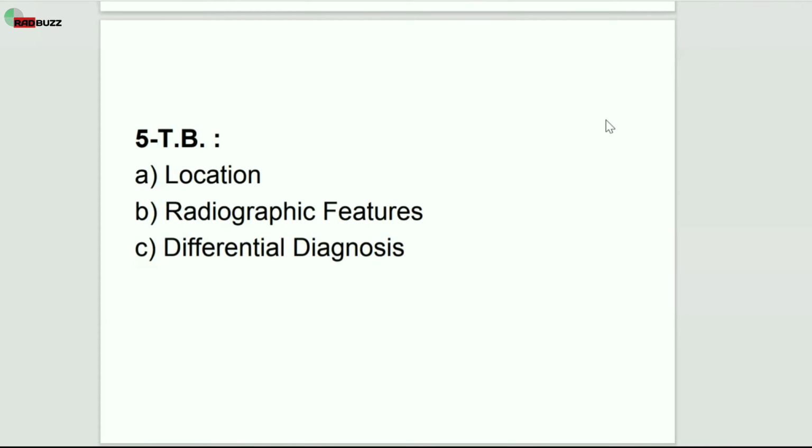Tuberculosis, known as TB, is one of the widely spread infections throughout the body. But today we will just see how pulmonary manifestations occur whenever there is tuberculosis. There are various stages, types, and presentations of how tuberculosis can look, and how it appears on imaging.